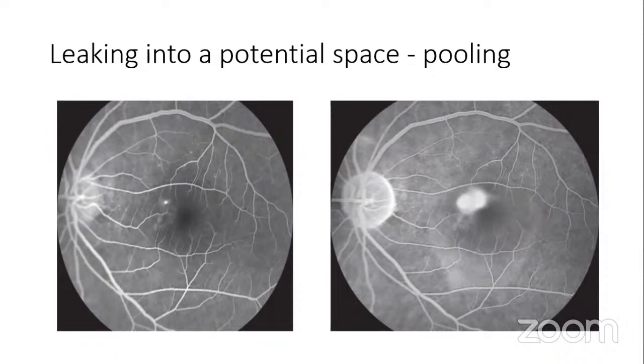So which phase would this be? This is a recirculation phase in this eye, actually. This is empty, this is emptying out too, and there is some form of background hyperfluorescence. So it's recirculation. The dye is getting diluted with time. So it's towards the late phase.